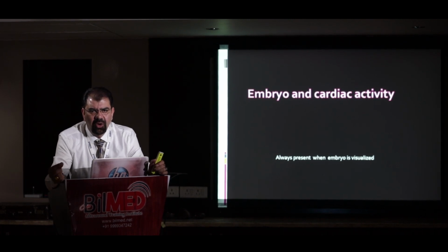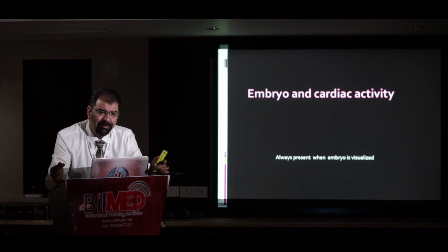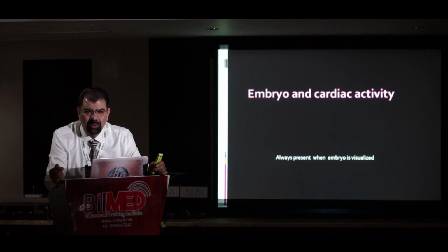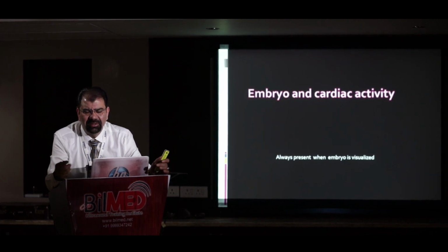Each and every normal fetus, if it is live, is having pulsations. It is you who are not able to see it. That is the reason you are putting a query and advising the patient to rescan. So don't think that fetal pulsations are not there. They are there since the beginning.